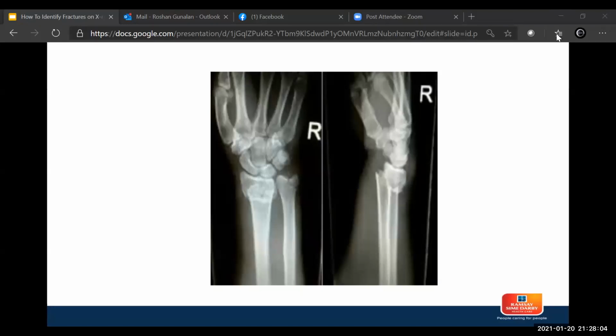This one is a difficult one. This is a very common fracture, by the way. So you will see the fracture. Okay, somebody says it's Colles fracture. The answer is correct, but the idea is how to read the X-ray, not give a diagnosis immediately. So that's what I was trying to avoid. I don't really want to tell. So Monisha said fracture of the right radius, ulna, distal end. Yeah, so that's correct. It's distal end.